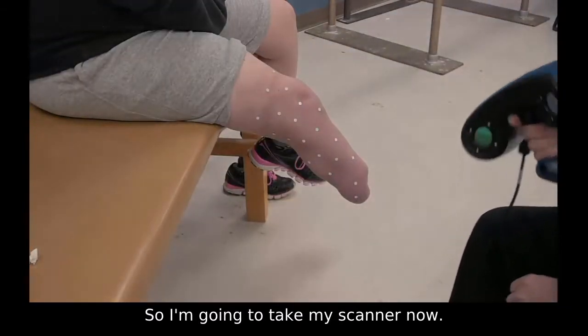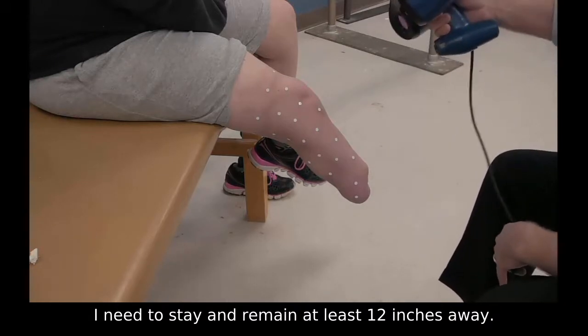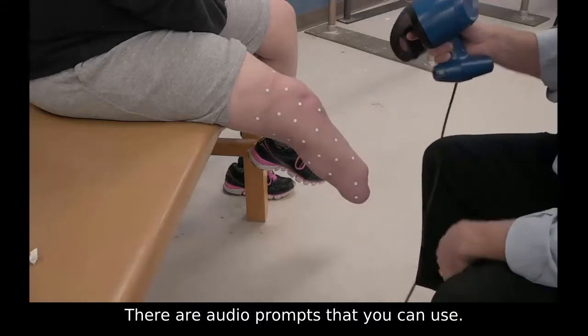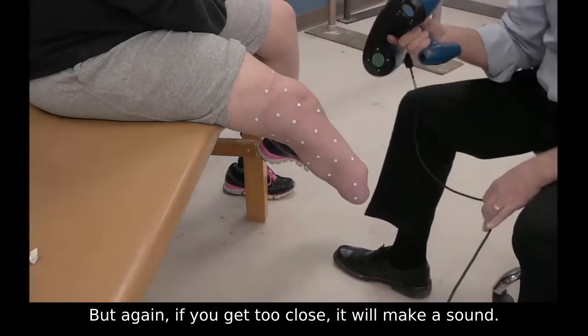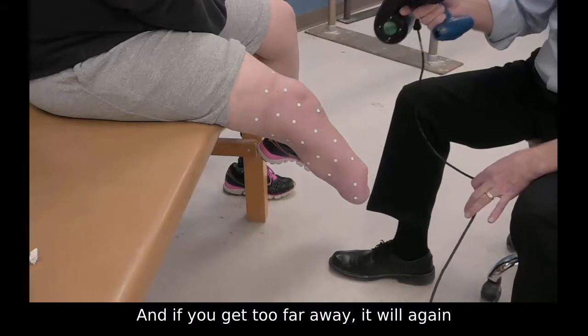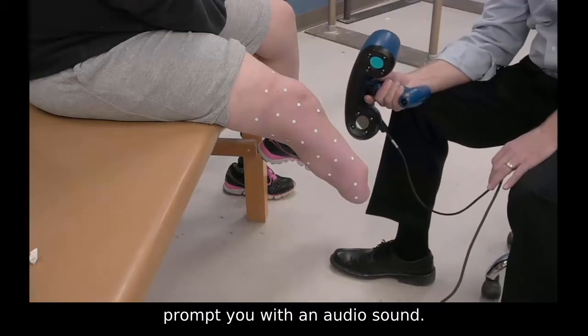So I'm going to take my scanner now. I need to stay and remain at least 12 inches away. There are audio prompts that you can use. I have it turned off for this demonstration. But again, if you get too close, it will make a sound. And if you get too far away, it will again prompt you with an audio sound.